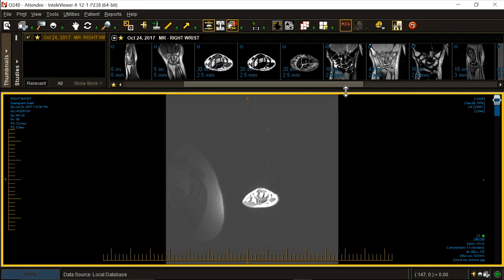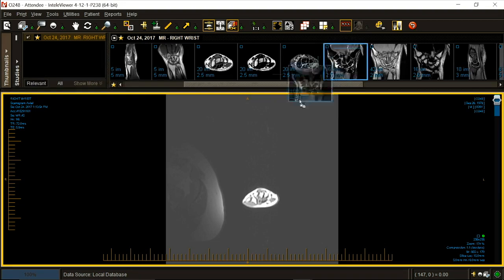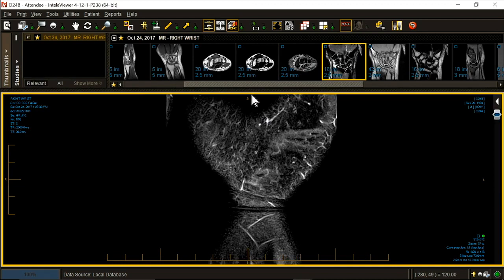39-year-old male, pinching pain, history of broken finger, and surgery. Okay, I'm going to do what I always do.